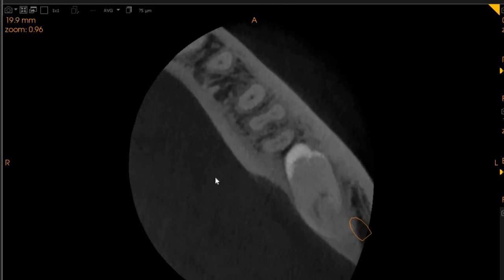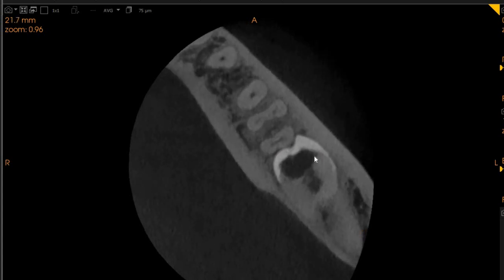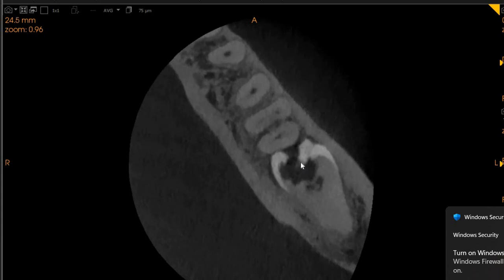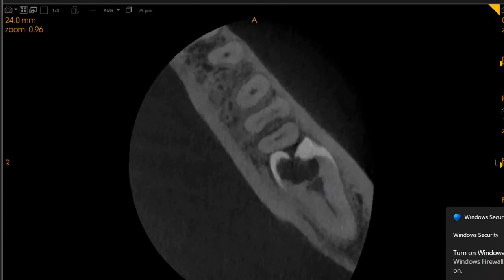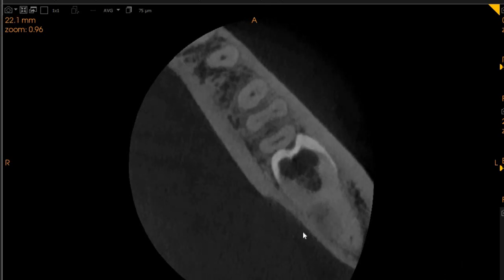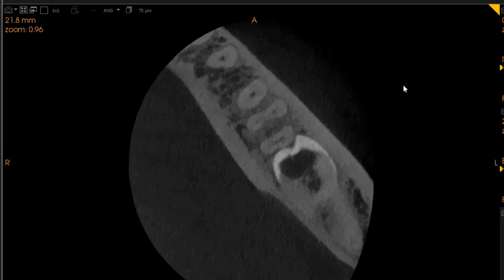And you also very clearly observe the 7 is compressing the root distally. It's compressing the 6, and also there is a significant cavity in the 7 as well. This cavity is actually encroaching into the pulp space, so this definitely is leading to pain and periapical infection.